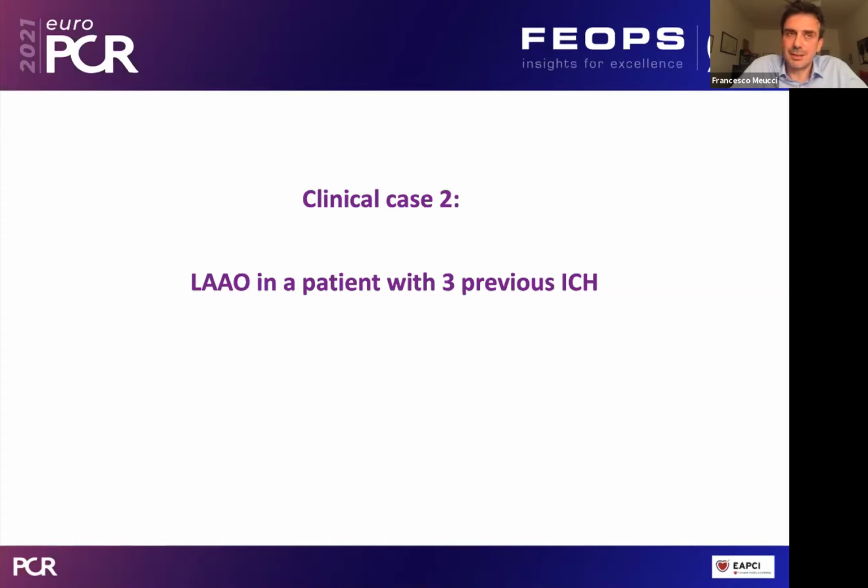In this case, we had a measure of 18 millimeter on the angiography, so a little bit smaller landing zone than the one measured by CT scan, but in the end, the 27 was fitting very well in the appendage due to the characteristic of this device that is very soft and is like a self-expanding stent, if you understand what I mean.